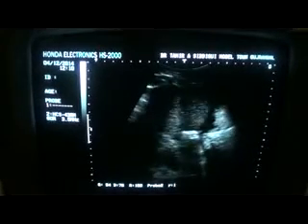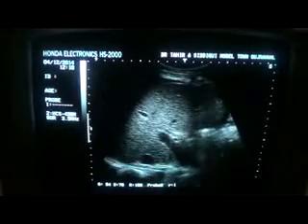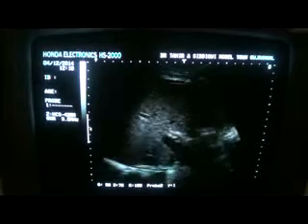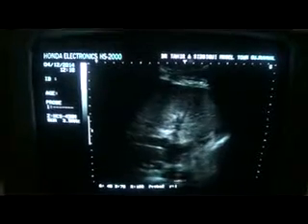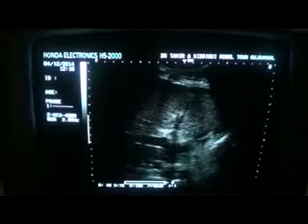So the point to study in this video segment is that a normal liver can be considered as being fatty or cirrhotic if you are unaware of this fact. So this is a normal liver. Thank you very much.